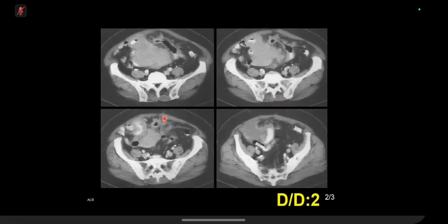It hasn't got any desmoplastic reaction, hasn't got any calcification within it. It is reaching up to the abdominal wall, and there is surrounding bowel wall inflammation as well. So could it be an inflammatory lesion there? It doesn't look like a collection.